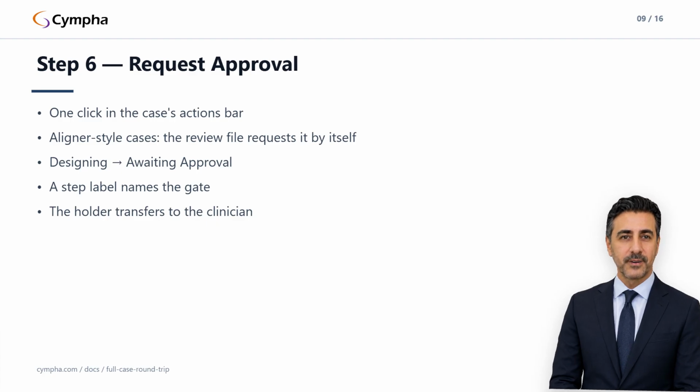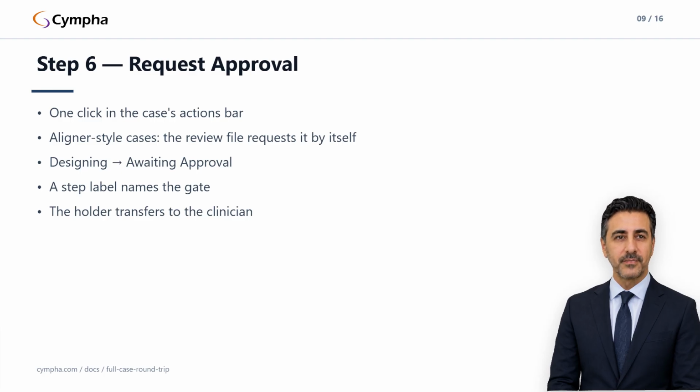Finally, the holder transfers to the clinician, and the clinician receives an email from Cympha with a link straight to the approval page for this case. The designer's part is done, for now.